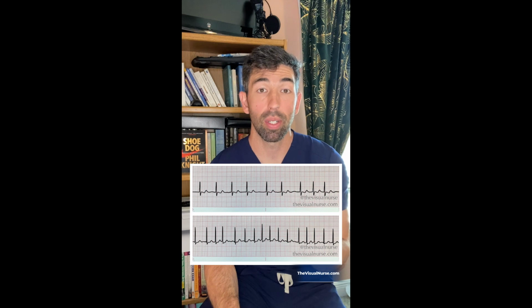Now, ECG appearances can vary greatly in Afib, from rate controlled to having a rapid ventricular response. The QRS may be narrow with typical supraventricular conduction, or it may be wide if an underlying conduction delay is present. But what we expect all of them to have in common is, say it with me, a rhythm that's irregularly irregular without any discrete P waves.